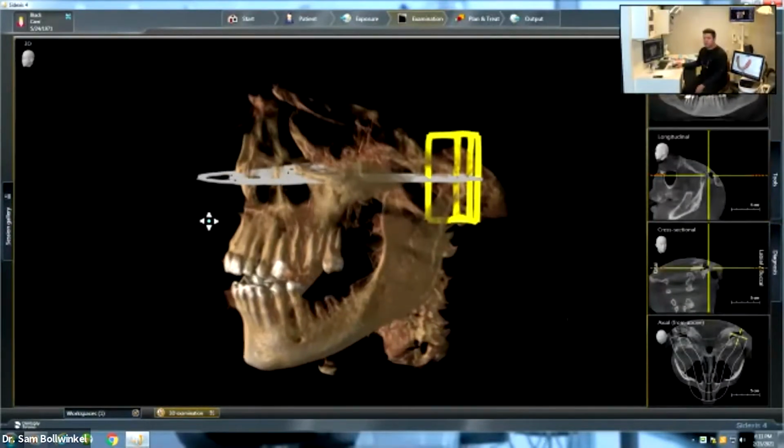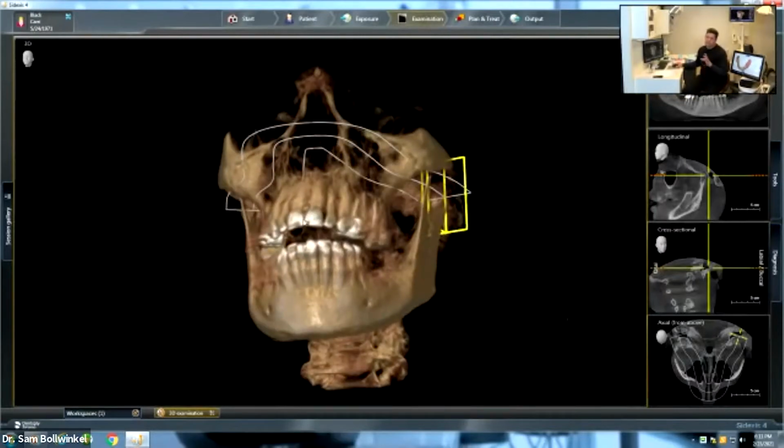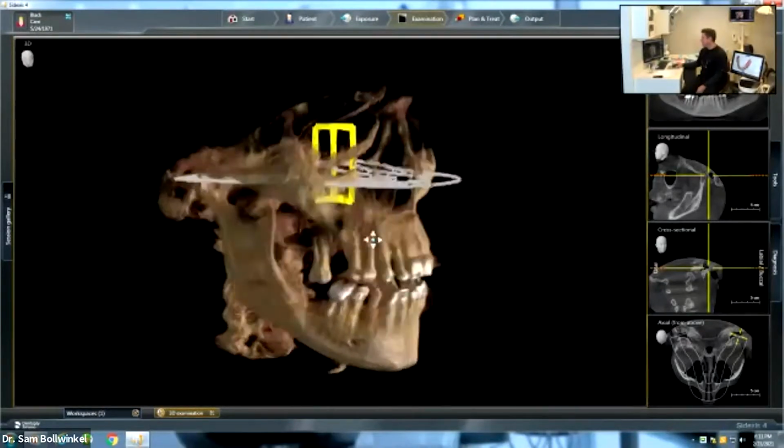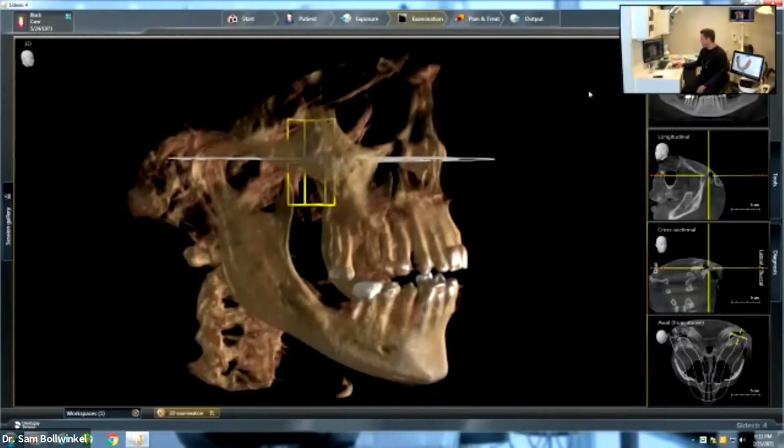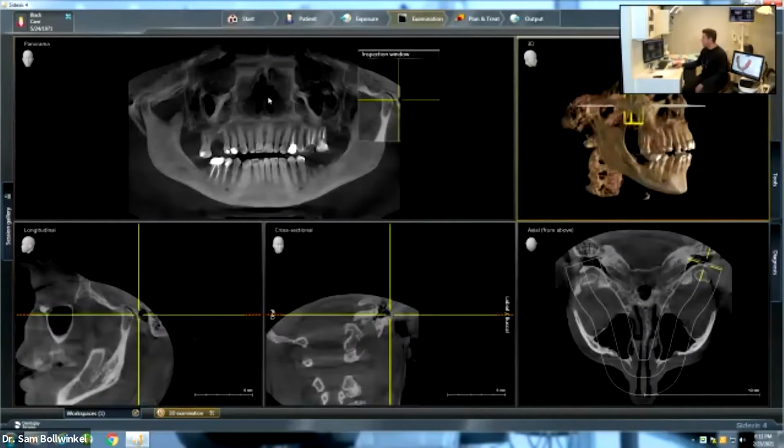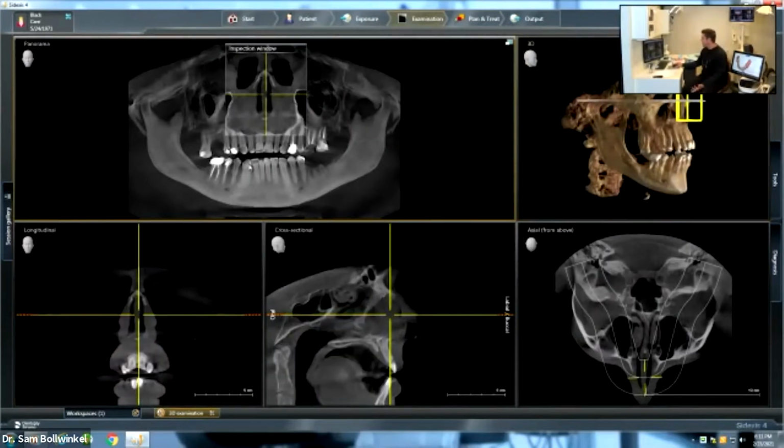If you're seeing that large on your screen, with the Zoom, sometimes depending on how the gallery is shared, click on my screen, make this large, you'll be able to see that imagery a little bit better. But this is just amazing technology to be able to see this. I show my patients this just about every time I take a scan. It blows their mind. But let's talk about what cone beam is. A cone beam is a device that takes about 1,000 slices, 1,000 different images, puts it together through the software, combines and creates this 3D image.